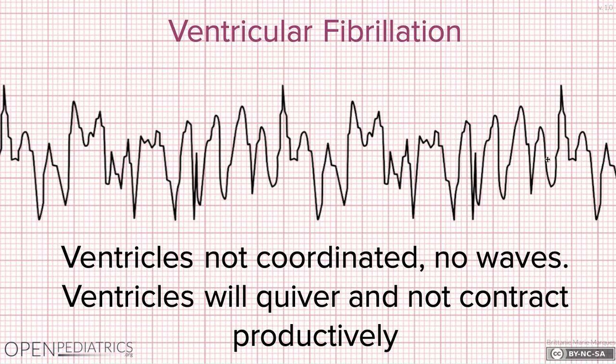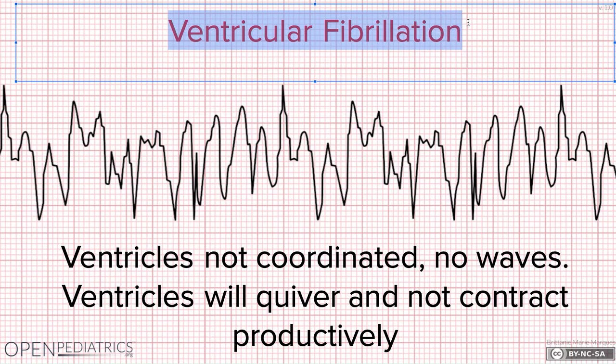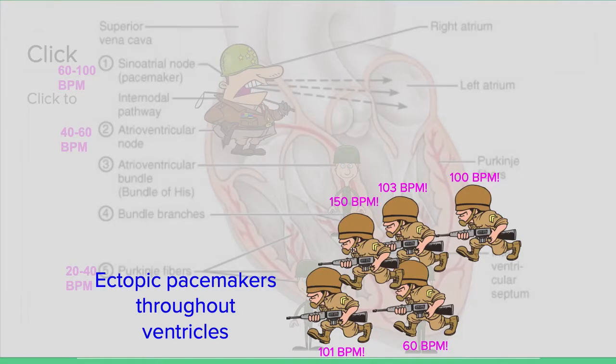Anytime you look at an ECG and it just looks like noise and you don't see any kind of rhythm, you can't identify any kind of wave, that's usually always ventricular fibrillation. Because the ventricles are so big that they produce such a strong signal that if they're doing something uncoordinated, they dominate and hide everything. And we just see a bunch of noise from all these cells talking at the same time and at different times.